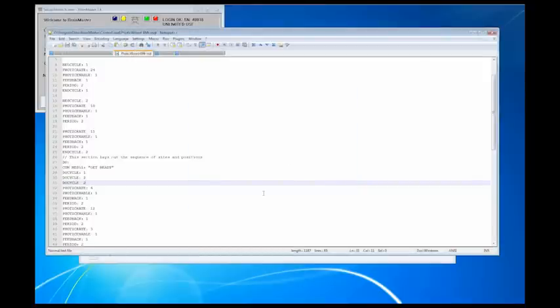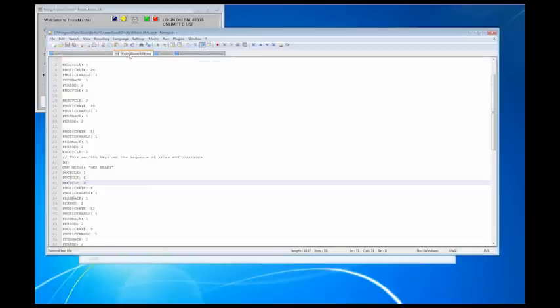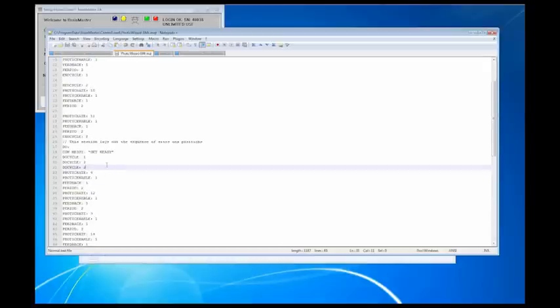Now, that is the biggest reason right there that I want you guys to download Notepad++. Microsoft has a built-in Notepad program. The only problem is you cannot save special file formats like that. That's where Notepad++ comes in handy, and the other thing that comes handy about it is I can have multiple ones open up in the same screen. That's why I personally like it also. So, when it comes down to photic rates and different things that are jumping, this is how I recommend you doing, and this is how you can do some of those features.